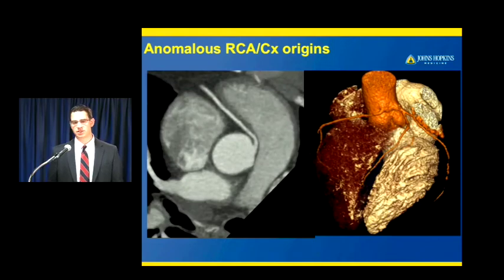However, as an aside, generally the right coronary artery management is not quite as definitive as the left. For instance, if you see a malignant course of the left coronary artery, that's pretty much always going to be fixed. Right coronary artery, it's a little bit less certain, particularly if incidentally discovered. A lot of times these patients will be left alone. The risk associated with this is not as well defined. Certainly there are case reports of people having sudden death because of these right coronary anomalies, but it's a little bit uncertain what to do in somebody who is asymptomatic, and whether a prophylactic repair is necessary.